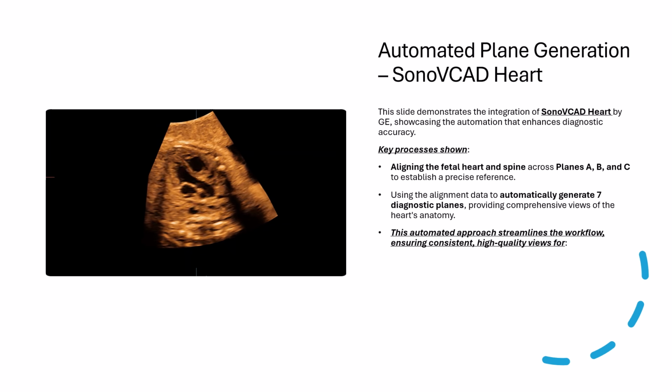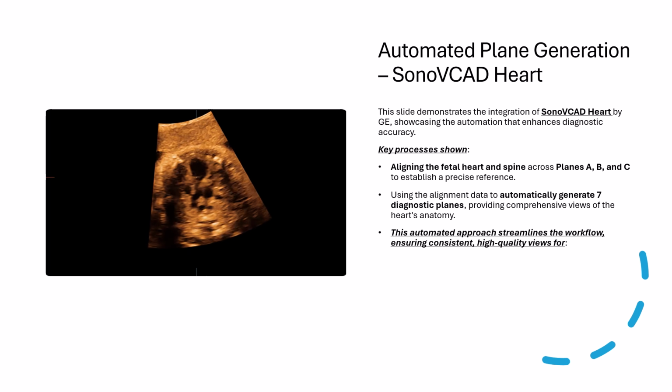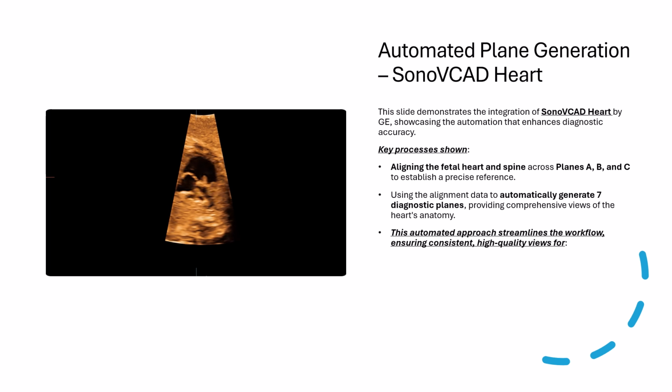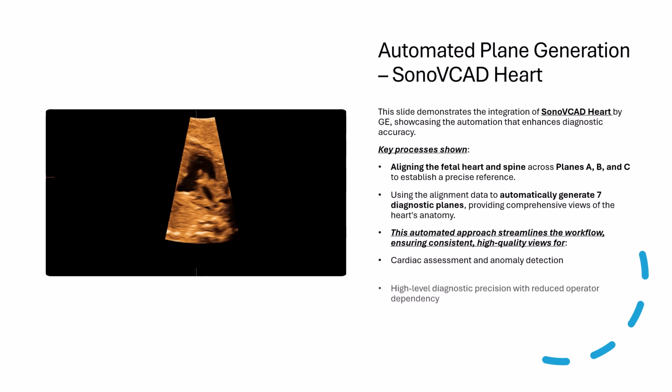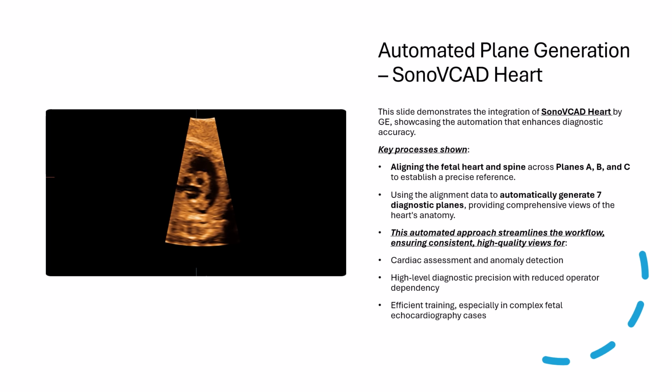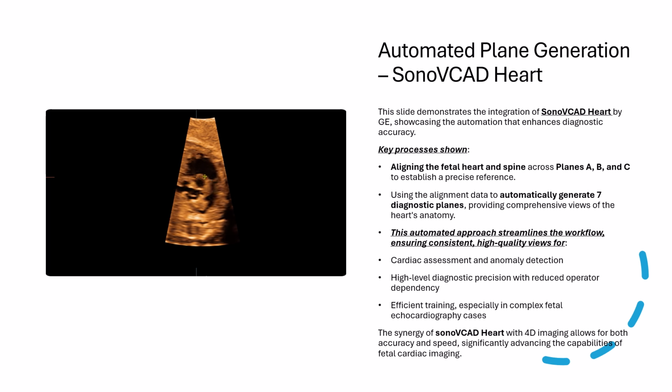This automation does more than save time. It also elevates diagnostic precision, especially in busy clinical environments or in centers training junior staff. The key benefits are a consistent, reproducible view that reduces operator dependency, streamlined cardiac assessments that facilitate early detection of anomalies, and an ideal platform for both routine screening and high-level diagnostics.